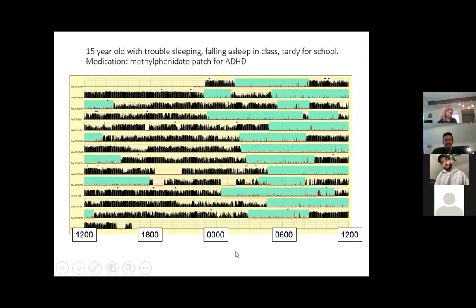had. So sometimes she's getting plenty of sleep. Like here, she slept from here all the way over here. But that's because she only got 6 hours or 5 hours here. And here, 1, 2, 3, 4, 5, 6 hours. And then she slept long here.